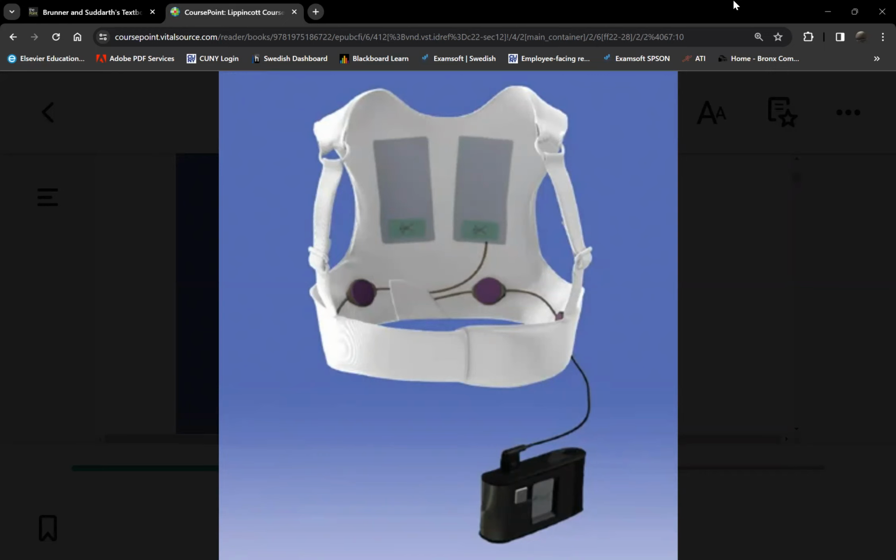It's still implanted inside the patient's skin, and the wires, the electrodes, are inside the patient's heart. So patients who have an infection, we cannot put in a permanent implanted ICD yet, but they need one. So this is the external one. It's literally a vest made of canvas, cloth.